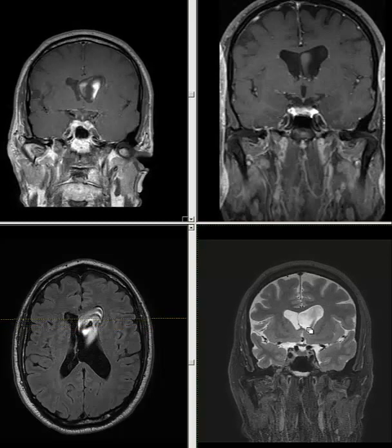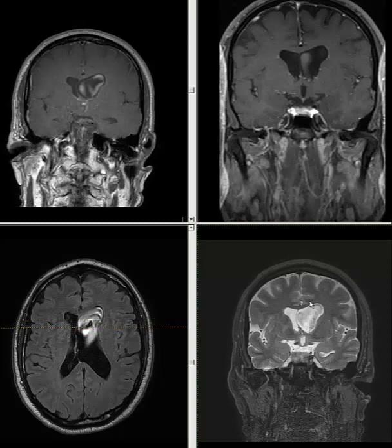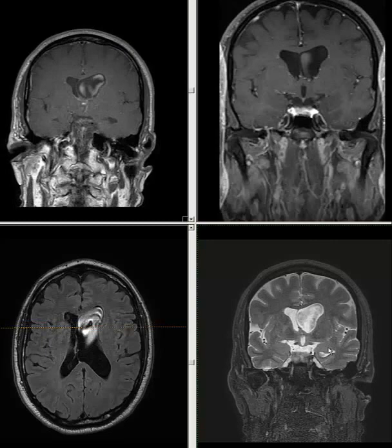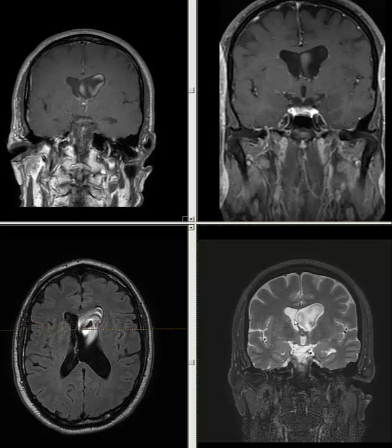So the left lateral ventricle was bigger to start with. Now it's getting even larger. The midline septum is getting more bowed toward the right side. So basically the ventricle size difference is, I guess, a normal variant, but the left side is larger because, just like an aneurysm analogy, the bigger part of the cavity tends to be weaker.